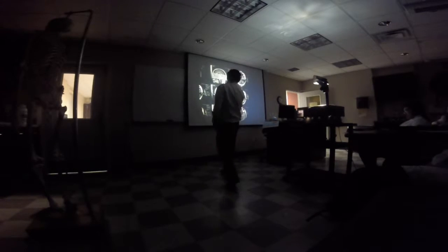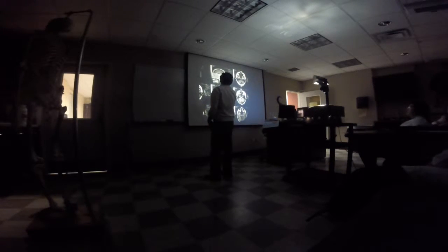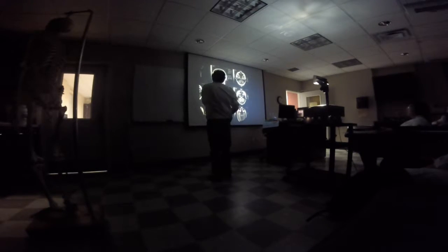By the way, if I would point to this, what would this be right here? Brain stem. The spinal canal, right here. So this has to be the spinal cord.